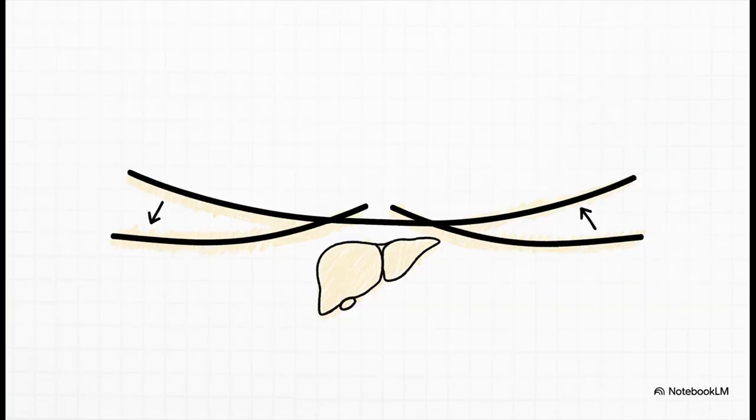All right, moving on down to D for diaphragm. See those two curved lines at the very bottom of the lungs? That's what we're looking at. We want to see nice, sharp, clear borders. And you might notice that the right side is normally just a little bit higher than the left. Any idea why? It's because the liver is sitting right underneath it, just pushing it up a little bit.